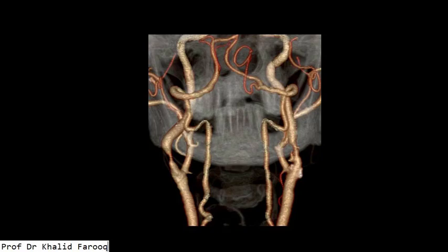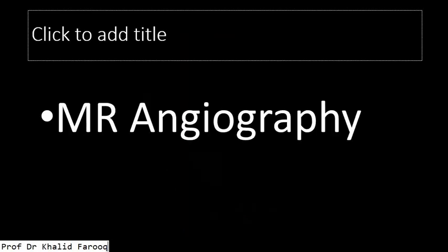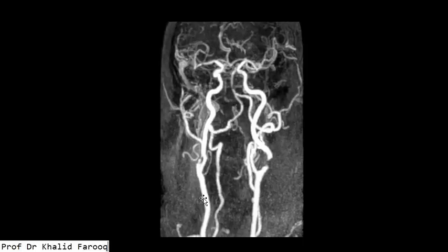Here we have MR angiography. Few examples. We can see there is non-visualization of proximal segment of the left internal carotid artery because of severe stenosis in this region. Mild to moderate degree of narrowing of right external carotid artery is also identified, but internal carotid artery appears normal on right side.